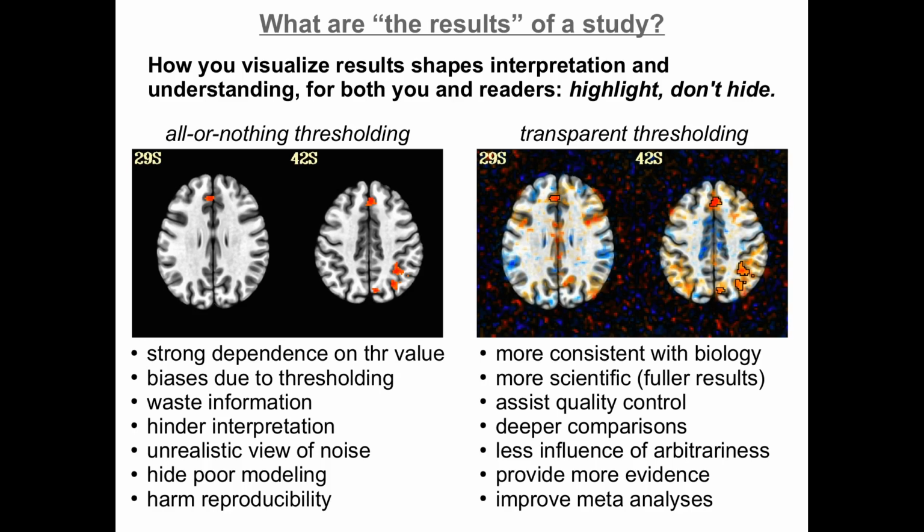If you ask me to do a task, my brain is not suddenly on-off localized, and particularly the BOLD response is not on-off. It takes a while to go up and come down, and it has a 15-second on-off time. And within a given sulcus and gyrus, there may be some parts that are more active and less active. It's a little bit different than on-off.